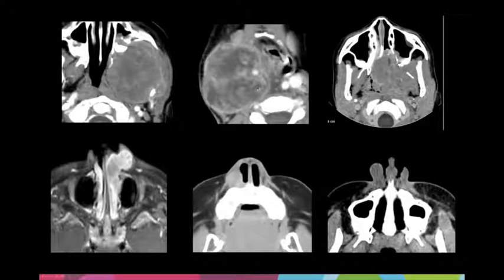Here we see a lesion involving the left nasal cavity extending anteriorly to involve the left nasal ala, widening the nasal inlet without aggressive bone destruction. 2 other patients with primarily nasal ala lesions, one age 4 and one age 10 years. Neither demonstrates bone destruction. These are the scary ones. They appear benign and non-aggressive, but do not let lack of bone destruction sway you away from the diagnosis of rhabdomyosarcoma.